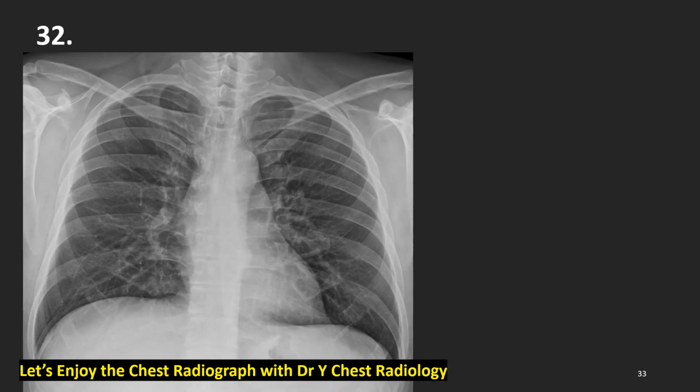What do you see with this middle-aged man's chest radiograph? What is abnormal for you? How about the aortic line or paraspinal stripe? Yes, correct. That's the point. That's abnormal looking. What is that?